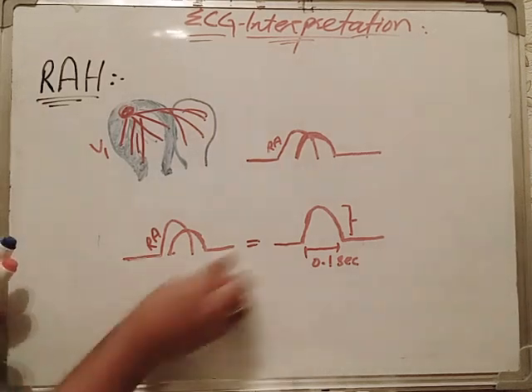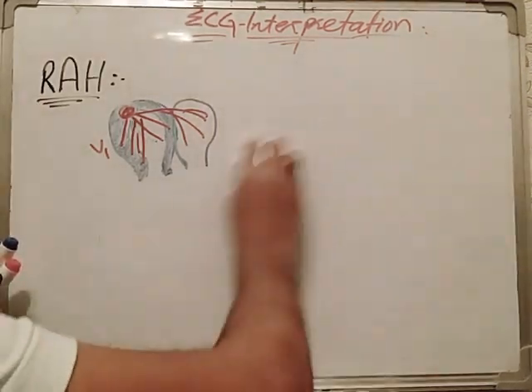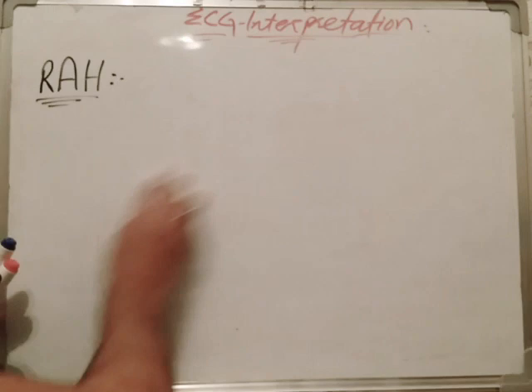Now we will discuss left atrial hypertrophy, what will happen in left atrial hypertrophy.